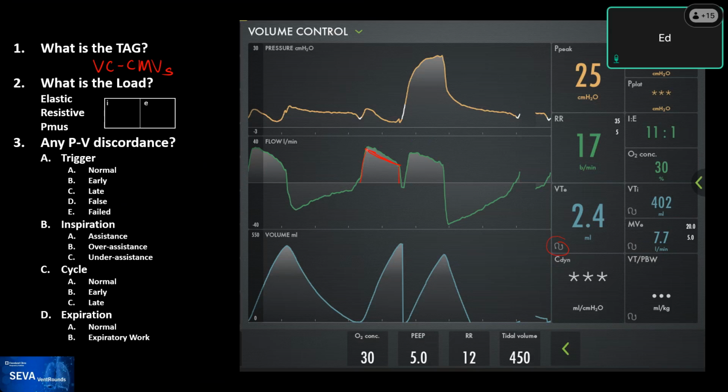You have to be aware of a couple of things that are also kind of unique to this ventilator, although others may do it too. One is that normally when we have been trained on volume control, we train that there is a square waveform or a descending waveform.